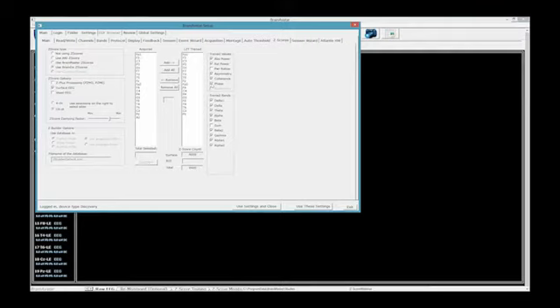The other place that you have to control your Z-score information is the trained bands area. Each of these is basically a component, about 500 in total, that you can have either checked on or checked off. Now, some recommendations, and this is only from a technical point of view. First of all, the sum band, do not use. The sum is more for monitoring in BrainDx. ANI doesn't have a sum band, so you don't have to worry about checking off anything.